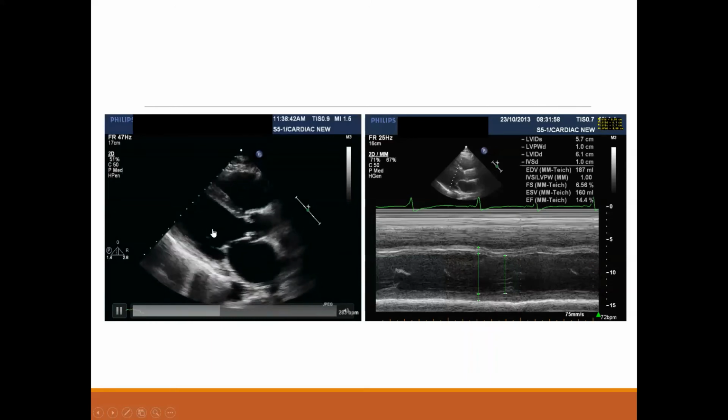You are right that the LV is dilated, the LV is impaired moderately or severely. There are some degenerative changes in the aorta. There is RV impairment. Also, the RV is impaired.